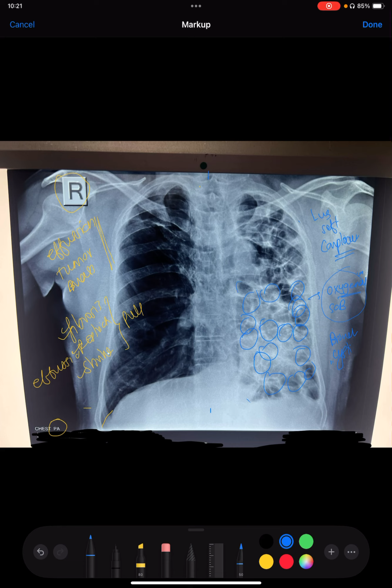So that was the reason the patient had multiple cystic bronchiectasis because of old infections, which were not healed properly, which were not treated properly, which led to significant cystic chronic bronchiectasis.